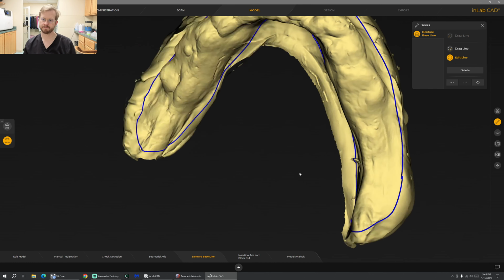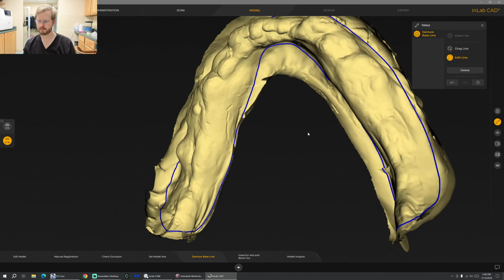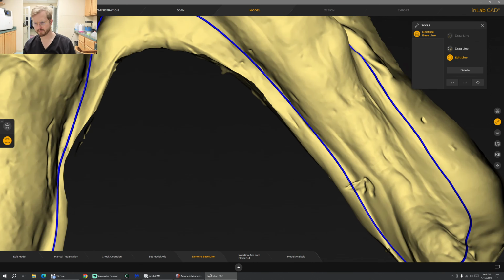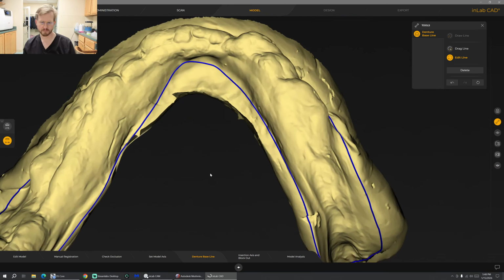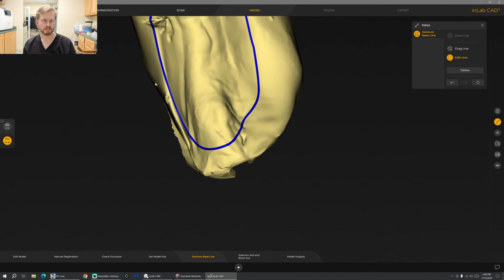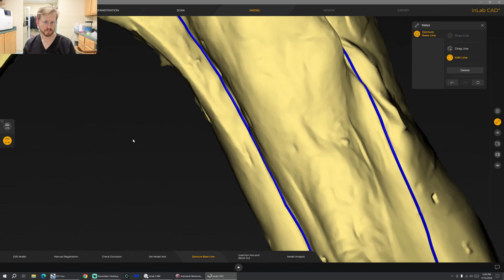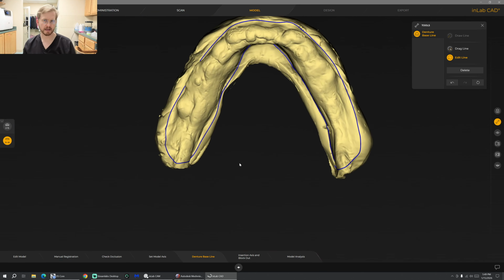Great. Fix this. All right, we can sit here and nitpick this thing all day, but I like that.